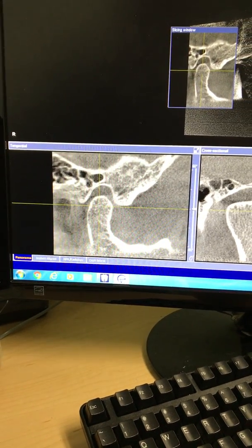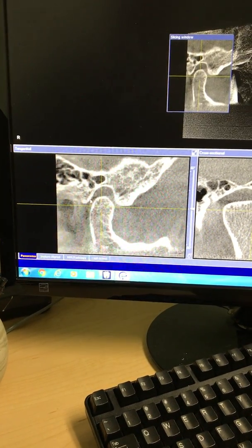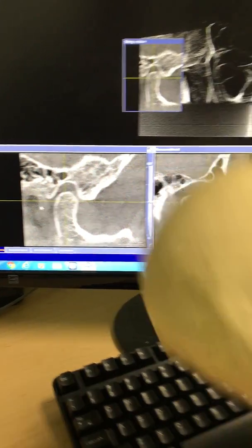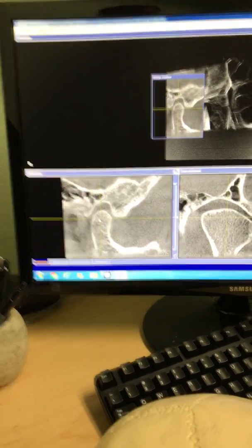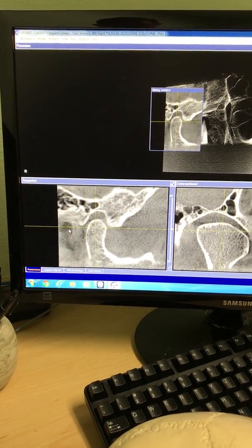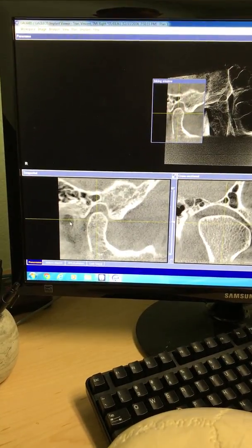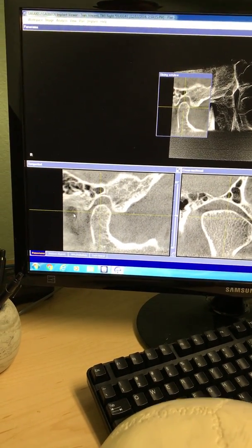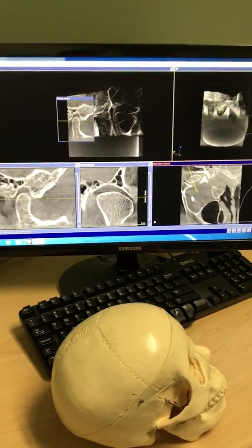Now, at any given time in this normal biting position, you will notice the space behind the condyle, and that's the ear hole, like what you see over here. That's like a reference point. The more this condyle moves toward that ear, the more the person will have ear problems associated with it. Headaches, ringing in the ear, loss of hearing, things of that nature. Not able to blow out, clogged eustachian tube, all these problems that are associated with the condyle being too far back. And it doesn't have to be much, it can be just a millimeter difference.